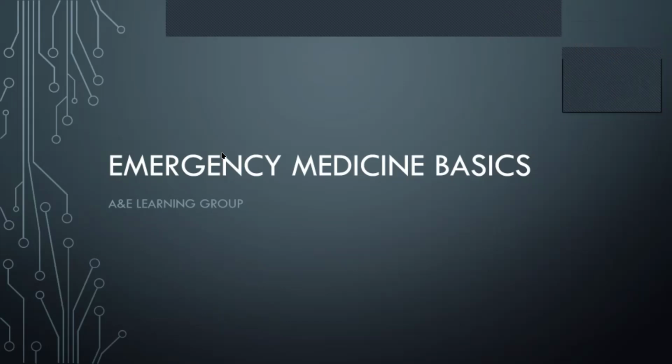All right. Okay, so just to start, the reason why I picked this topic is a lot of young doctors that I've seen in the emergency department will very often diagnose wrist injuries quite easily on an AP view. But once they've got a lateral in front of them, it's just kind of like, oh, okay, that's nice.